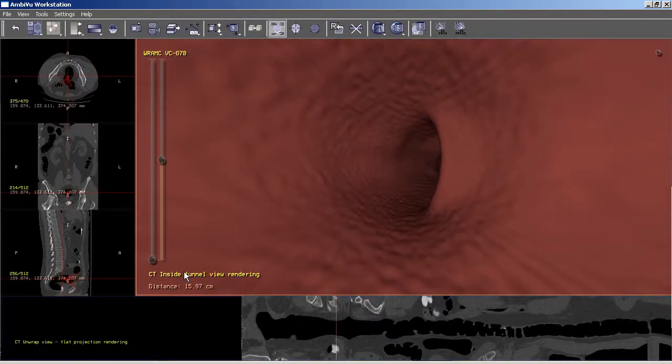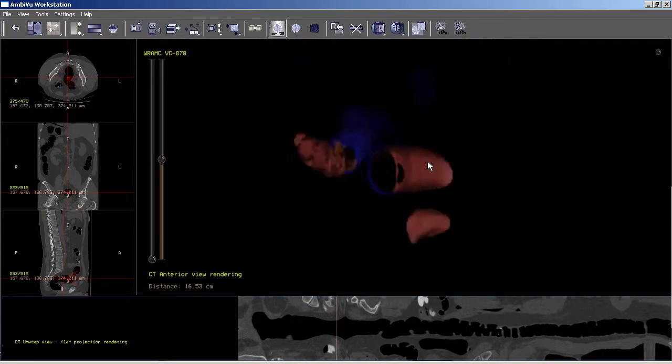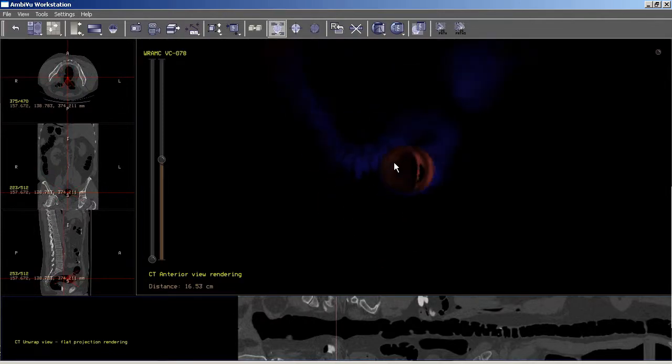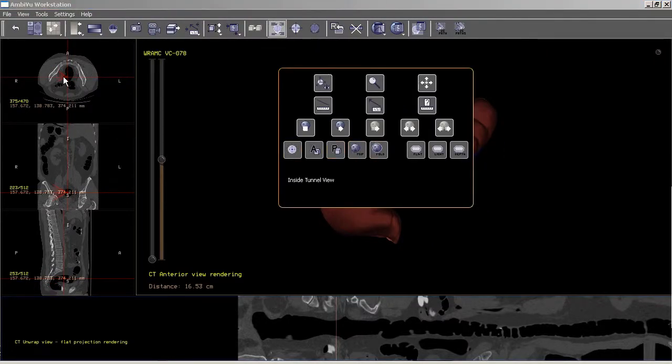This hanging protocol has an inside view and an unwrap view. Let's start with this view. On the right click button, these are the options we have for the view. So we are currently in tunnel view. There is an anterior and posterior. This is the anterior. Right click, left click and drag, and we'll move around the anterior posterior domain. It's possible to see here where the camera is looking at currently. So anterior posterior, there is an exterior MIP.